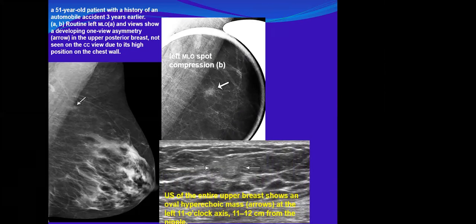So, okay, this is the ultrasound. You ask for ultrasound. What is your impression from the ultrasound?